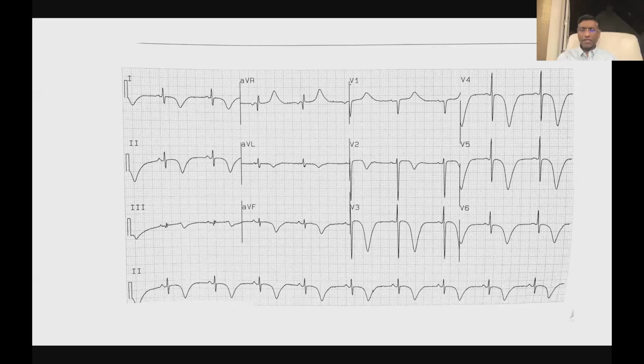So maybe electrolyte abnormalities, good, yeah. Electrolyte abnormalities can cause some T wave changes. We'll talk about them more, but remember that it's more to do with the ST segment shift with potassium shifts, with hypo and hyperkalemia. When you get this dramatic T wave inversion like this all across the precordium, there are actually very few things that can do it.